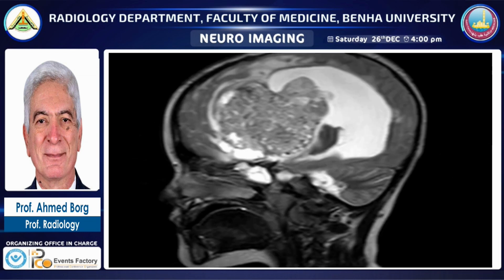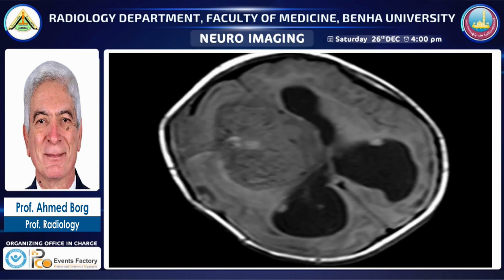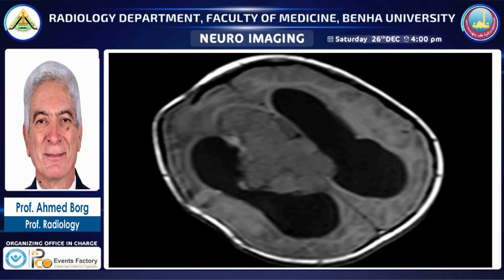Large mass at the region of the foramen of Monroe. Again, FLAIR image. Subependymal nodules.